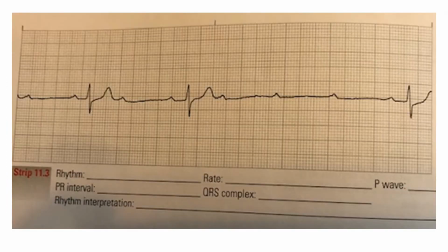In 11.3, in this rhythm, it is considered irregular. The rate is 30. If you look at the rate between the 6-second strips, it does have P waves. So you have lots of P waves, more P's than QRS. So therefore, we already know that we are in an AV block, a high-grade AV block, actually.